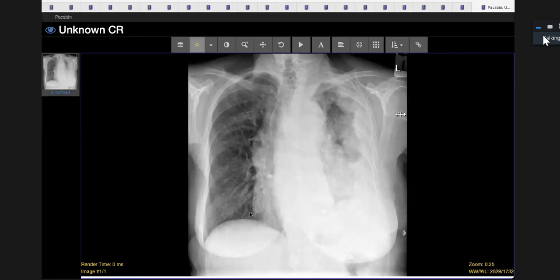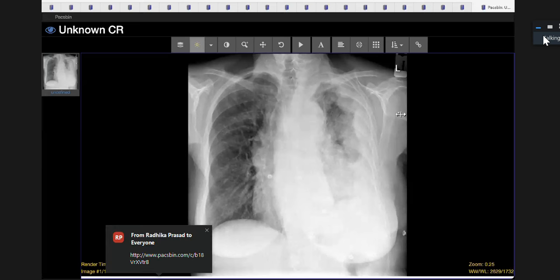It might be her own occupational exposure. But the other things you want to look at now, you could say to get extra points, I would be looking for other features of asbestos exposure. So I'm looking for calcified pleural plaques. I'm looking for signs of fibrosis. Those show that you're thinking clinically about this patient as well. Makes sense? Mesothelioma, this is.